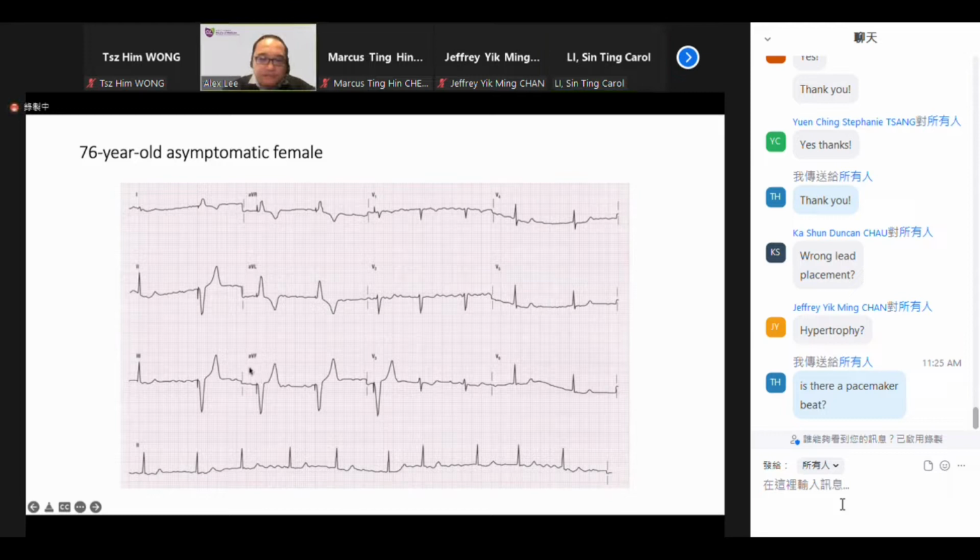What is this? Is a Q wave. Okay, it's a Q wave, and also some tall T wave. Okay, tall T wave. What is this? Maybe pacemaker spikes. Okay, pacemaker spike. Okay, so this is how we go in exam. Usually if we point towards something, a larger area, and you still can't recognize it, we'll point to a smaller one. So if you mention this pacemaker spike, then I can give you no further clue.